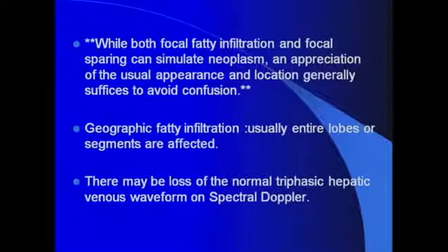One important thing that may help supplement your confidence and sensitivity for diagnosis of early fatty infiltration of the liver is the use of spectral Doppler evaluation in the hepatic veins. Normally you should expect to see a triphasic hepatic waveform, which is a representation of opening and closing of the tricuspid valve and the atrial contraction.